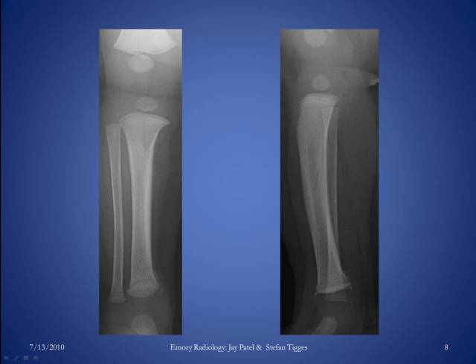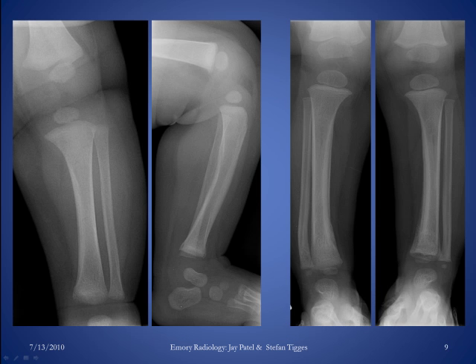So this is a frontal and lateral radiograph of the bones in a child who has been a victim of non-accidental trauma. And on the left image, we are seeing a sliver of bone distally adjacent to the tibia, which is basically a classic metaphyseal lesion or corner or bucket handle fracture. On the lateral projection, we're seeing fractures here and here, anteriorly and posteriorly, and those are also known as classic metaphyseal lesions. If you see these fractures, let the ER clinician know, I'm concerned about abuse here. This is a high specificity lesion. The Child Protective Services likely needs to be notified.